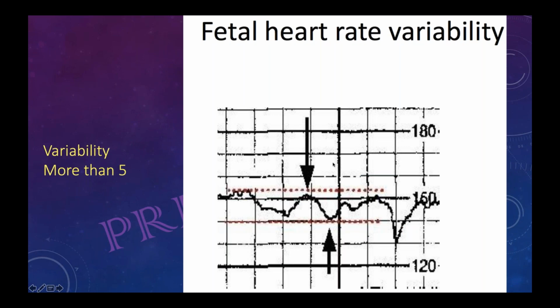Now again, same thing in a magnified manner. So now this is the bigger picture. You can see this is the lowest part, this is the highest part. So you have to calculate the distance between them, and you'll be able to find the variability.